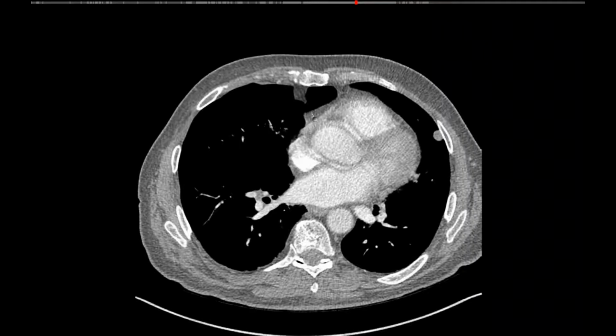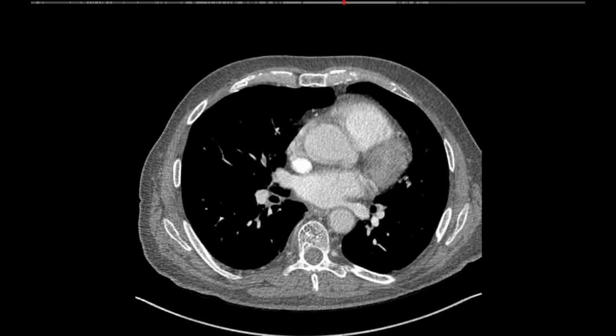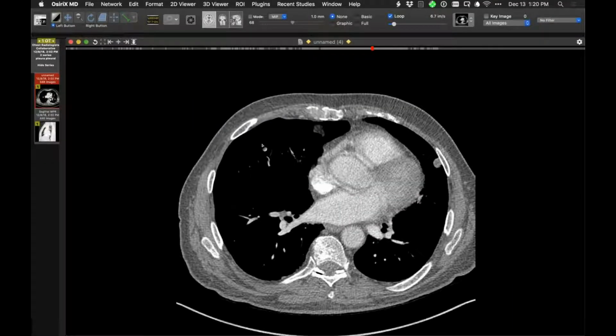So okay, it's a pleural adhesion that's just tethering this fat. Something like that. Yeah, I can't imagine it being anything else. That's just really a curiosity, isn't it? Yeah. So I don't know why these things are popping up.